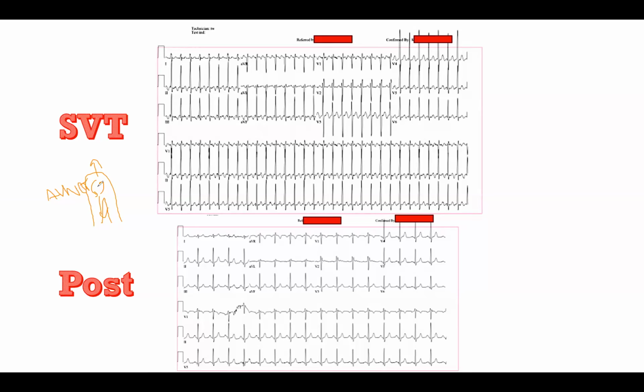than 70 milliseconds? And so this is why I'm showing you both the 12 lead in sinus rhythm and the 12 lead in tachycardia, because what you're trying to do then is compare what is going on from the moment the QRS depolarizes to the T wave in order to see if you can convince yourself that there may be an inflection, early or late following the onset of the QRS. It turns out that this patient actually, I believe, had AVNRT.